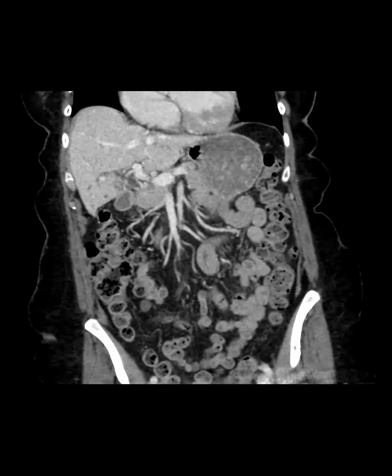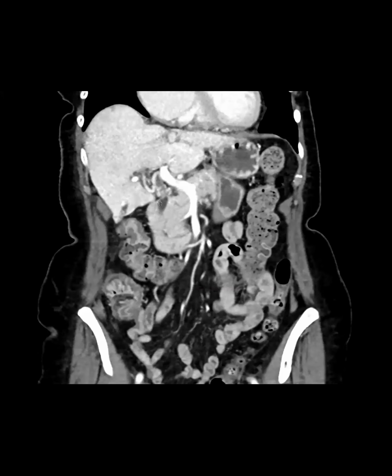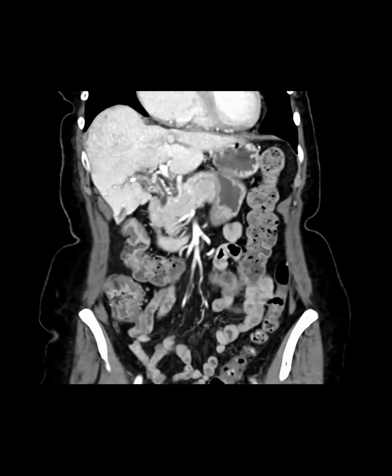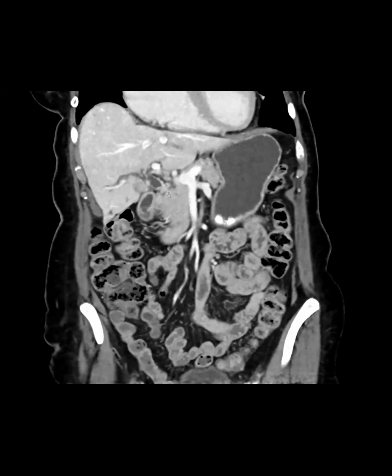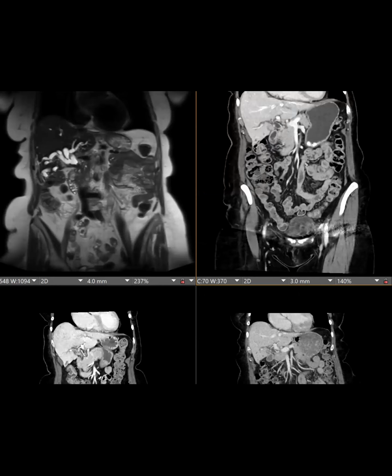It's right there, and then on the subsequent one, it's right there. And Aarti, you mentioned the undulation. This is right here. It's so clear in retrospect. Yep, exactly. And there's this.